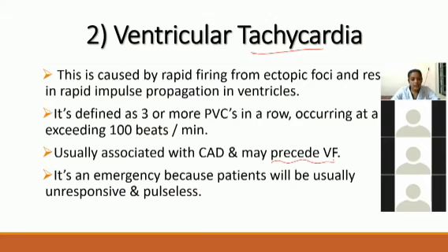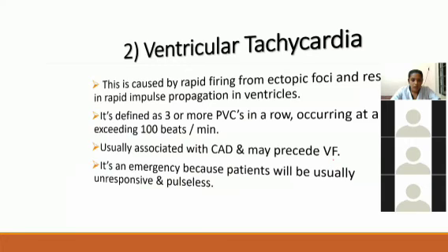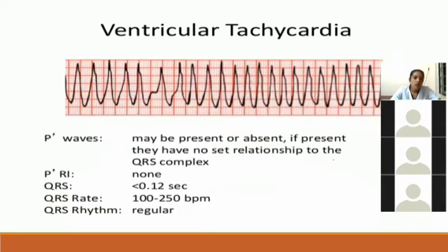Ventricular tachycardia is an emergency because patients will usually be unresponsive and pulseless. So we will give a defibrillation shock immediately to the patient according to the protocols. So this is ventricular tachycardia. I think you can appreciate that there is no P wave.